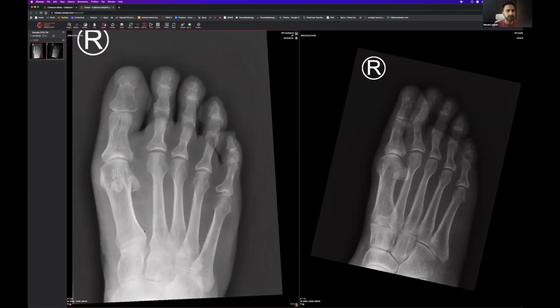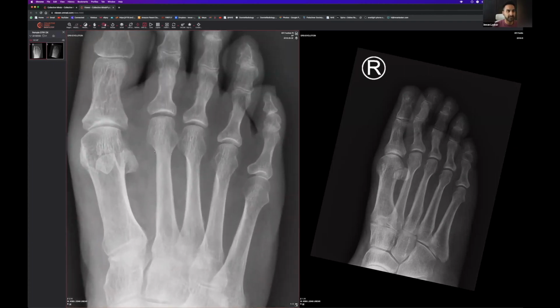So let's try and do this one. First off, I think last time we had a stress fracture, and this all looks very, very smooth, doesn't it? We kind of just go along like so, go along like so. Everything looks pretty good so far. Nothing obvious going on there at all. We can't see any evidence of a stress fracture whatsoever in this particular region.